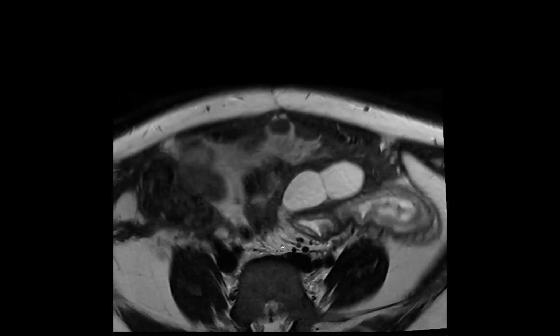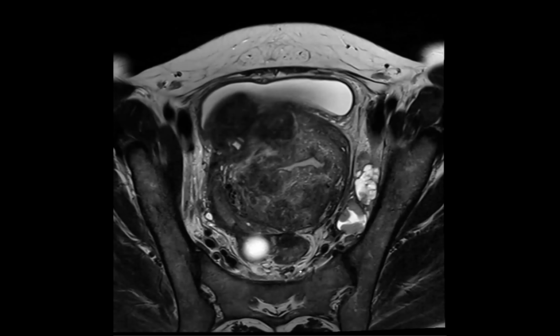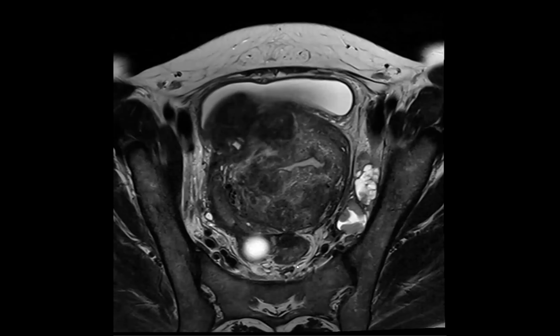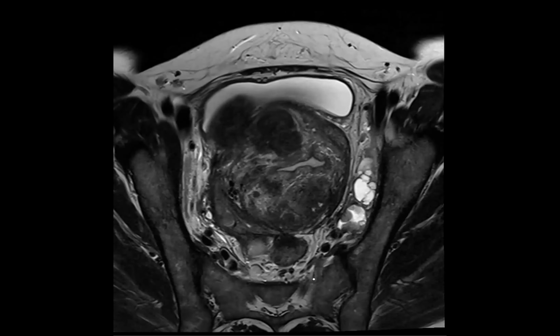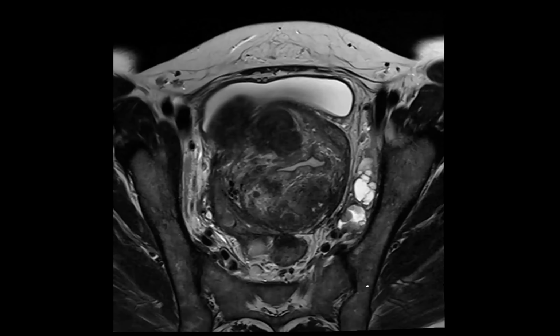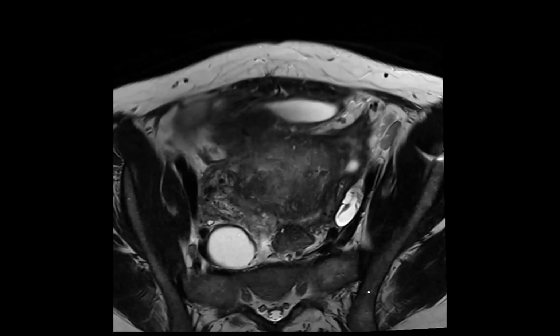Okay, so we had a debate about this because to me it looked benign. But malignancy was raised, and the patient was prepped for a pretty extensive surgery, debulking. And this all came back as benign endometriosis. Did it come back as polypoid endometriosis? I don't remember specifically polypoid, but the pathology was just endometriosis.